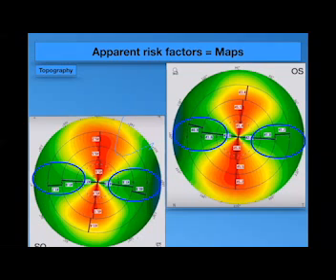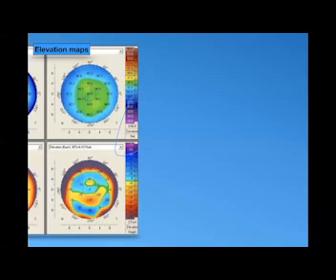So as I said before, the thinning of the superior cornea with protrusion means ectasia and not keratoconus. But you have to see on the slit lamp the ultimate thinning, the real thinning, not just scarring or pannus. If there is a normal thickness at this point, and there is a steepening higher than 49, even 50, I will go for refractive surgery without any worry. Let's go to the elevation map.